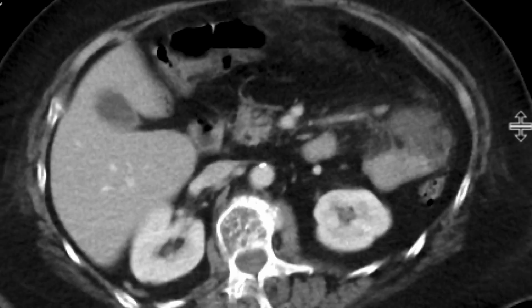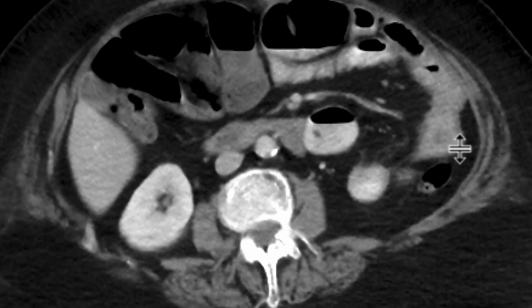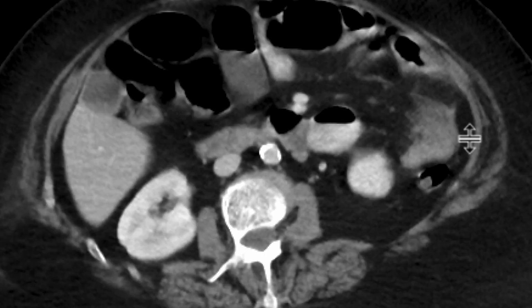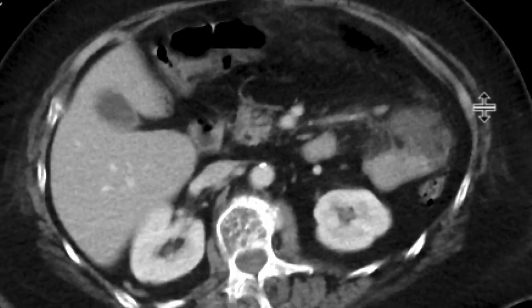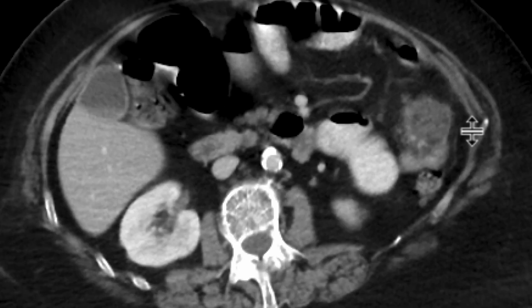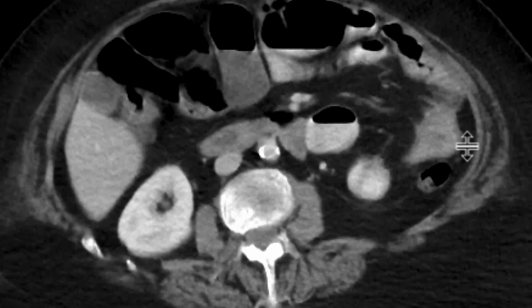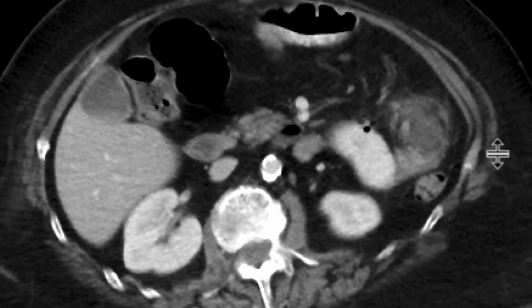least partially loculated. And it's really intimately associated with several loops of bowel over here. Some of them contain contrast. And so it's hard to know what's causing this based on these images itself. It's possible there's a small bowel diverticula which has undergone inflammation, so small bowel diverticulitis with some fluid that's developing.